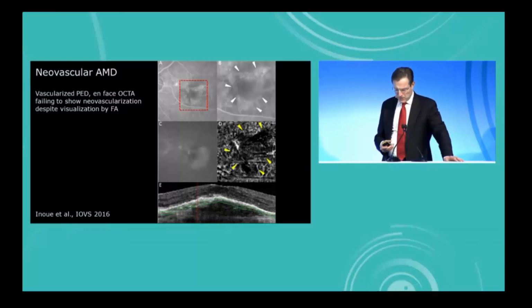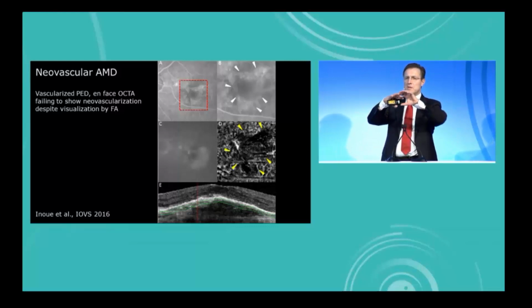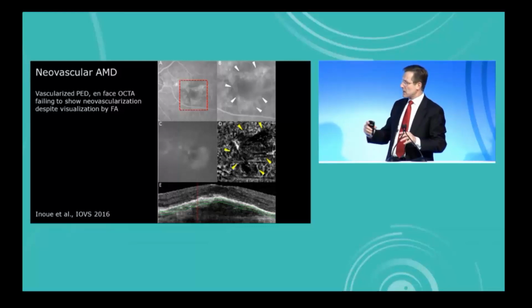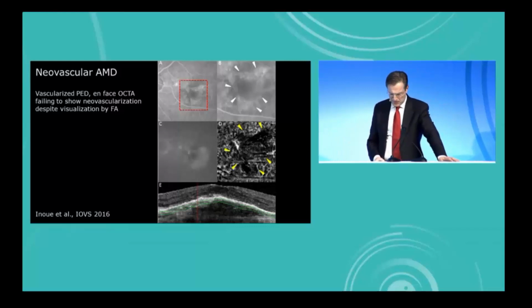So when you look at the lower image, you can see green lines that define which distorted layer has been selected for display in section D as a presumed neovascularization or at least a layer of interest.